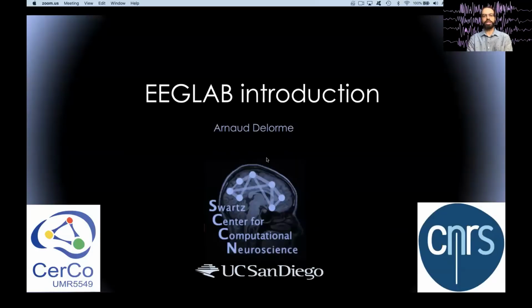EEGLAB and how to use EEGLAB on NSG. First I'm going to introduce EEGLAB and show you some basic processing using EEGLAB. The first part doesn't have anything to do with NSG. In the second part, I'll show you how to use EEGLAB on NSG, and I'll try to do some demo. So we'll have to cross our fingers that everything works fine.